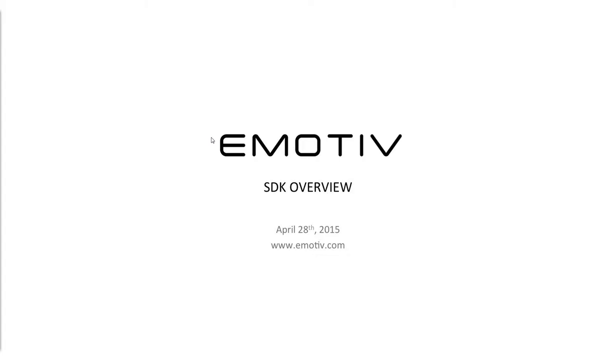So it'll look fairly similar to what you saw for the Windows SDK. The examples are mostly just run from the command line though in Linux. Okay, thanks. Cool.